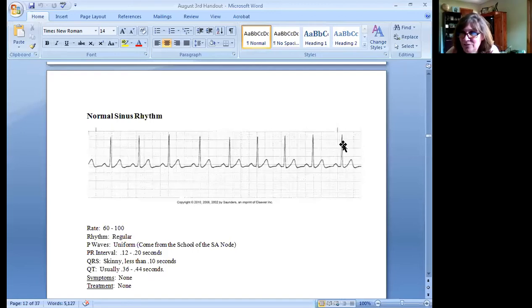So let's not count this guy on the end. For my 6-second method, I would say my heart rate is 1, 2, 3, 4, 5, 6, 7, 80-ish. But it's almost 90-ish. You can really tell. Large box method, 1, 2, 3 1/3. So what's 300 divided by that? It's about 90. That heart rate's closer to 90 than 80, to be honest.